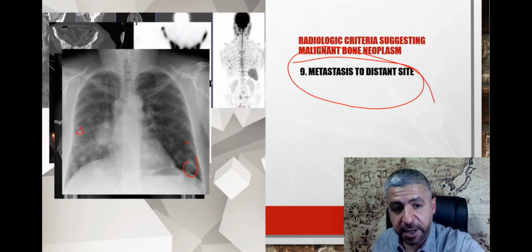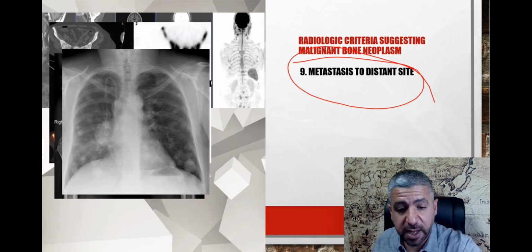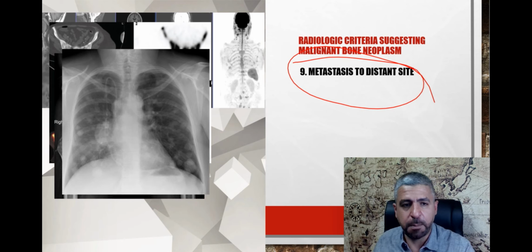These are very nicely demonstrated lung metastasis of osteosarcoma. Osteosarcoma commonly metastasizes to the lung. In fact, most of the sarcomas commonly metastasize to the lung, especially osteosarcoma. It has a very high predilection for the lung, forming these large rounded lesions, and it's one of the most common causes of spontaneous pneumothorax in young adults. Keep that in mind. The examiners love it in the board exams.